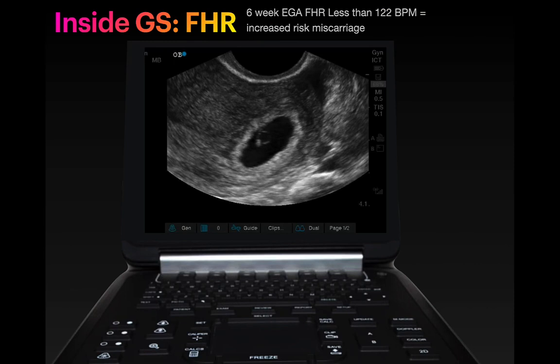So fetal heart rate can be helpful, especially in a patient who's coming in who's concerned about their first trimester pregnancy and bleeding. It can give you a good sense as to whether or not a pregnancy is likely to be successful, because if the heart rate is above 120 at 6 weeks or above 158 at 8 weeks, then that's a good prognostic sign for the pregnancy.